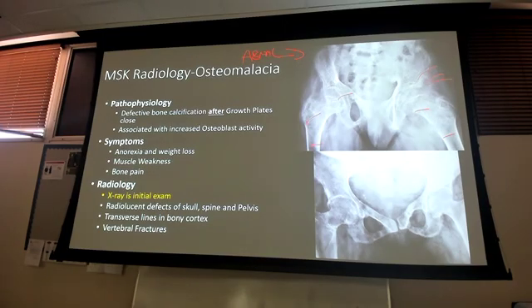Now I'm going to erase them and do them again. Transverse radial opaque lines right here. Boom, boom, boom, boom, boom. Coming across some of those areas, okay? Why is that happening? What's happening is the bone is softening, decreasing in density. The osteoblasts are trying to fix it, but it can't. It's too much. And those horizontal radial opaque lines are where you're having that increased osteoblast activity, and that's what's popping on the X-ray. It's trying to remedy, it can't.